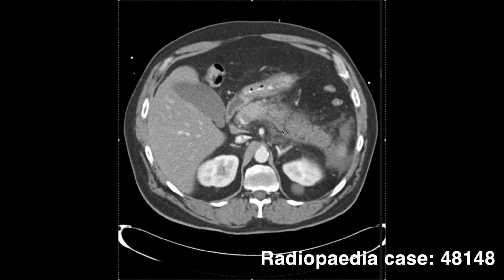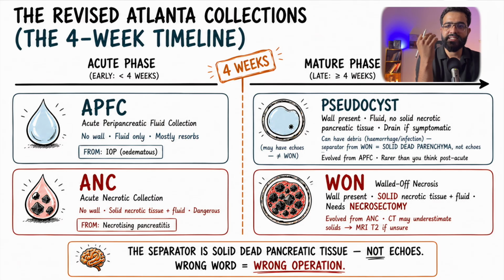And that is why the portal venous phase is your workhorse in pancreatitis. Necrosis shows up as areas of hypoattenuation that fail to enhance, clearly darker than the surrounding viable parenchyma. Complications, the monsters we hunt. This is where radiology really earns its keep. Pancreatitis has a list of complications that are individually dangerous and collectively lethal. Your job is to find them, report them clearly, and use the right terminology.